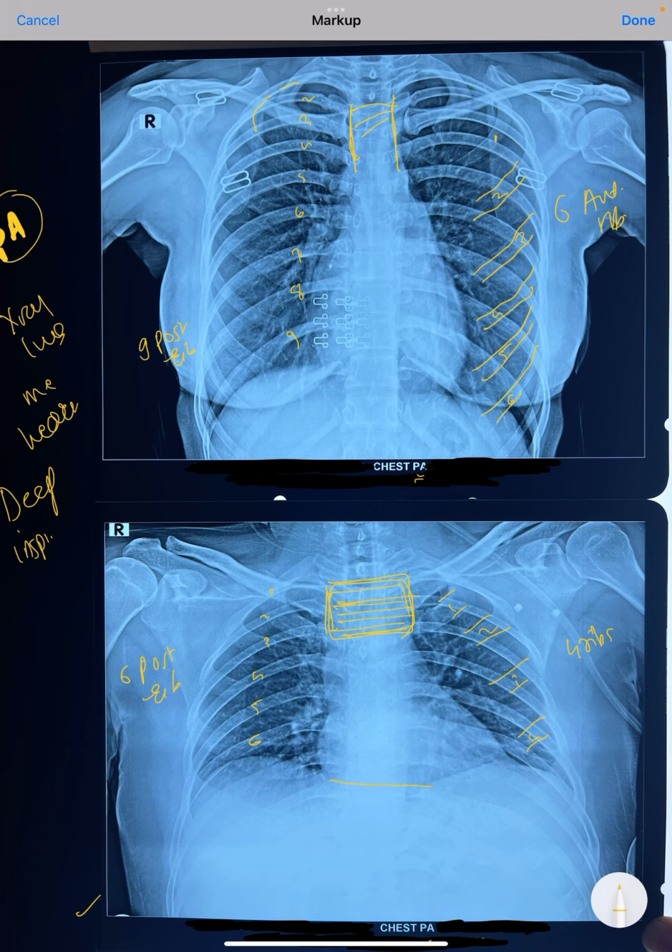The lower border of the heart or the base of the heart will always appear very flat and transverse, whereas here the heart base will appear globular. On the X-ray with poor inspiration, the heart shadow will not be seen very well, whereas in deep inspiration, a very bulb-like typical slender heart can be seen with very good clear markings, which are not obviously present here.